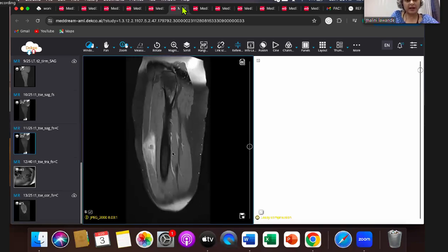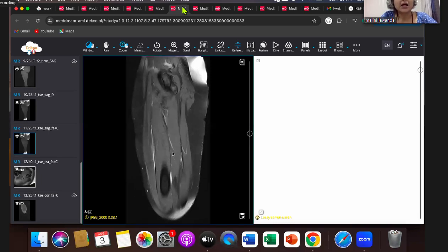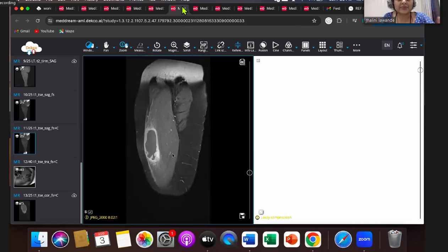So, intramuscular abscess. Whenever you have an intramuscular abscess, you want to see whether it is coming from an osteomyelitis focus or from infective arthritis. Here, this patient has only an intramuscular abscess, often seen in children when they are given an intramuscular injection in the thigh. Then they come with abscesses. Or just hematogenous spread from some other infective foci, you can have an abscess in the muscle.